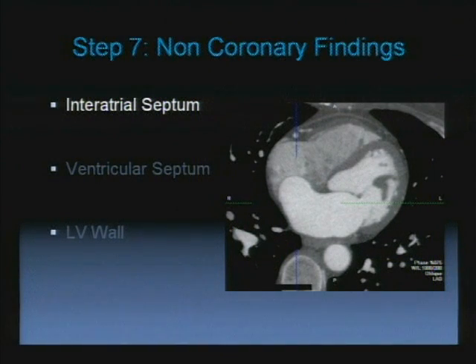We will look at the non-coronary findings, the cardiac non-coronary findings, and I find that this is equivalent to the review area in the chest.